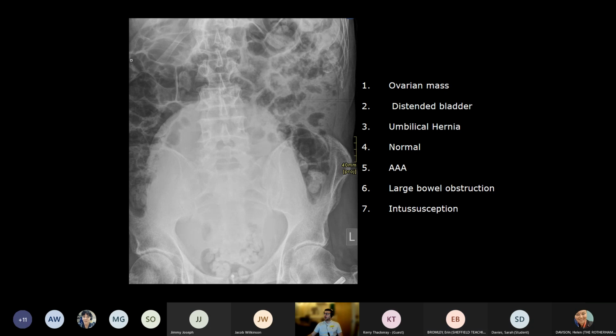Yeah, so distended bladder, I would say. I mean, if it was the only X-ray, it could be either, couldn't it? This, I think, is a tiny tip of a urinary catheter that's been shoved in. So you could do another X-ray and see if it's gone down after that catheter's worked its magic.